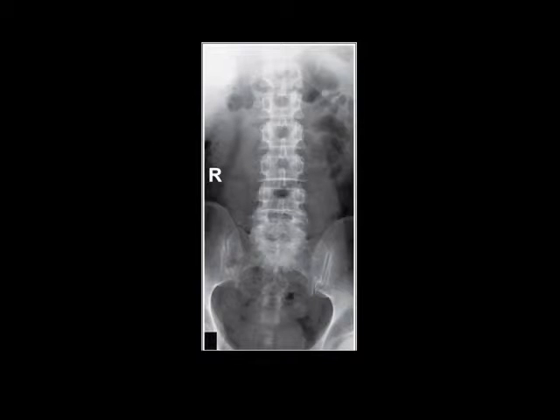Okay, I'm going to discuss a way to bring all this together into a single learning point. This will be the big takeaway from this lesson. So we have this image here. How do we know whether or not this is a good image?